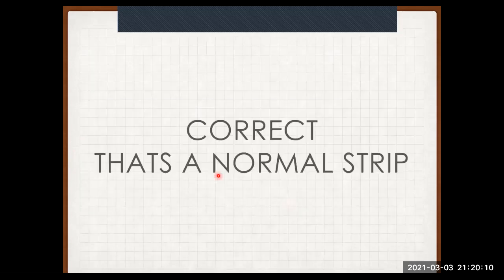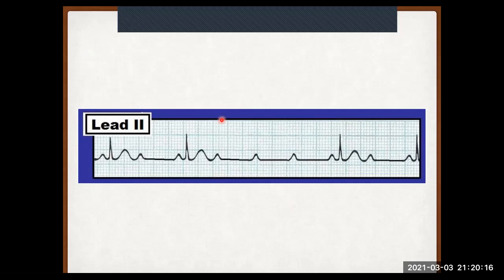All right, so it's a normal strip. There's nothing wrong with that. Okay, let's look at this one. And again, if you want to challenge yourself, pause the video now. I'll give you a minute and then I'll start talking in a little while.